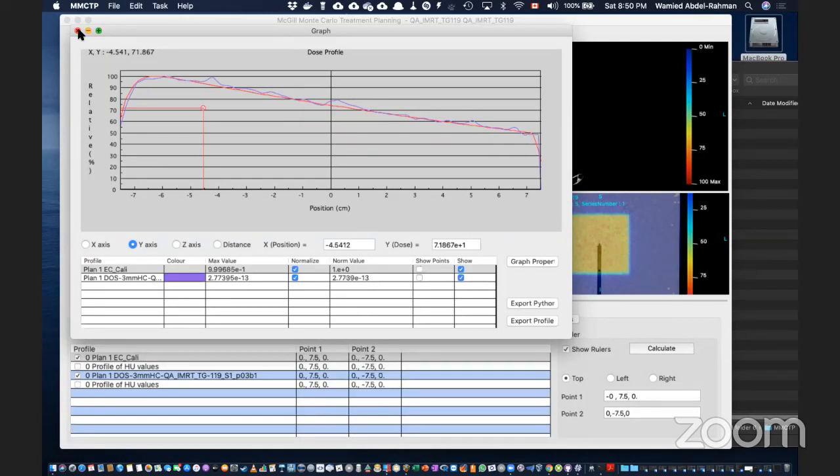Now with Monte Carlo, I have an input file. I have a beam model, and with that beam model, I try to see if my beam model can actually reproduce the measured data of the LINAC. Remember, this is something we talked about before: we do the optimization. For example, if I'm using an incident energy on the target of 6 MeV, tweak it to 6.2, put it at 5.8, and do a comparison of the PDD measured with Monte Carlo.